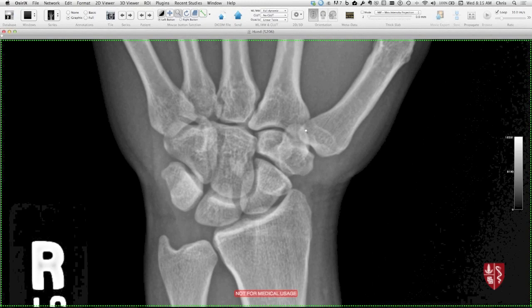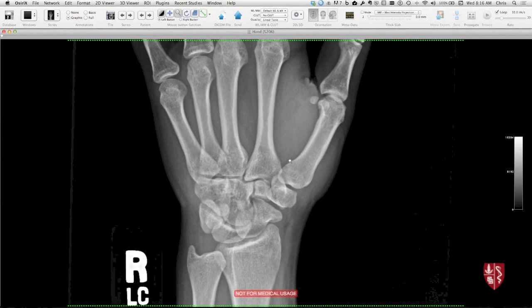When we look at the PA view, let's just go through the bones here real quick, right? So as I hover over, you shout out what bone I'm talking about. Okay, here, scaphoid, lunate, triquetrum, and then there's one superimposed over that too. Pisiform, good. Okay, and then this one with the thumb. Trapezium goes with the thumb. Trapezoid, capitate, and that one, hamate. Okay, good. So there's this thing in the hamate that's kind of sticking out, almost looks like a pedicle in the spine. What structure is that? That's the hook of the hamate, and it's a little bit like that coracoid that I showed earlier. When you see it on end, it can be tricky to diagnose anything with it, but you want to try to pay attention to it because people can injure that.